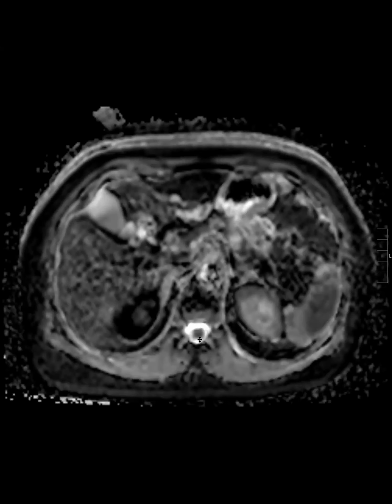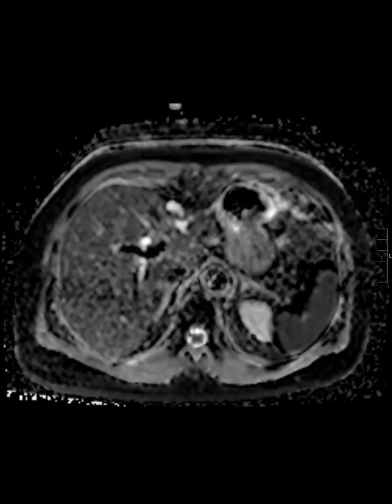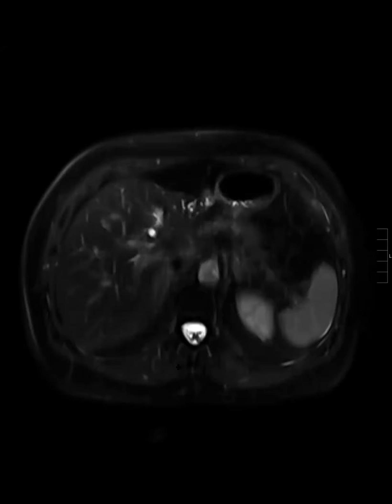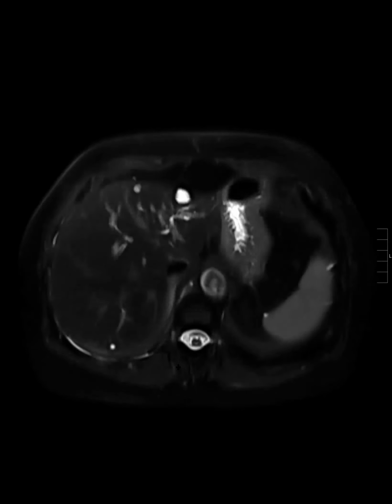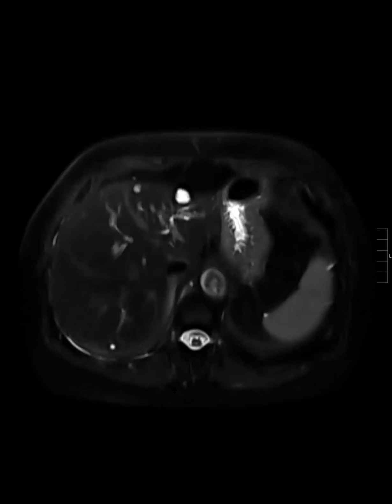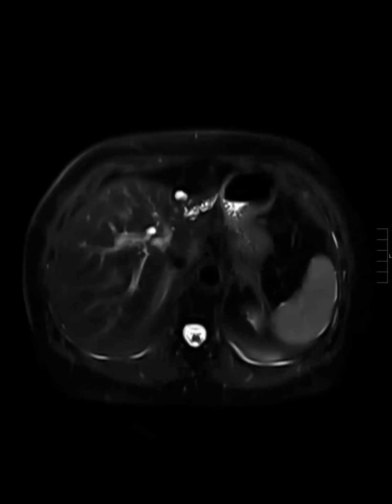Yeah, I don't see any. Is that something that's necessary? No, this one looks more facilitated, but most of those which have a neoplasm associated with them will have some diffusion. That makes sense. Yeah, that's where the lesion is growing, or the invasive component at least. Nice case.